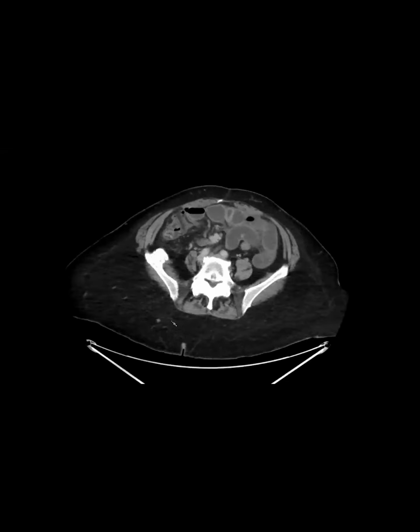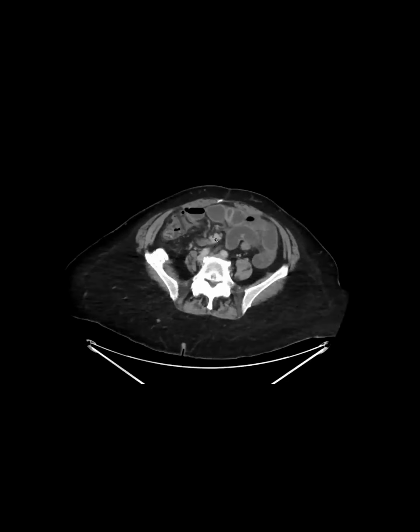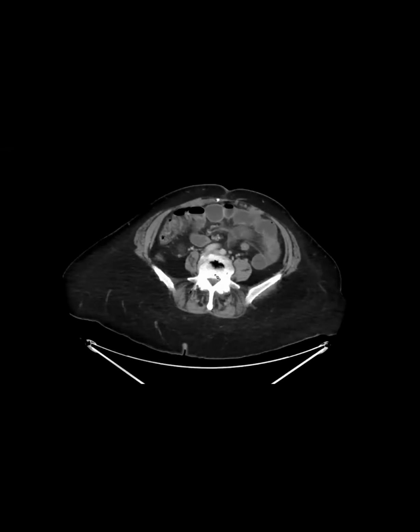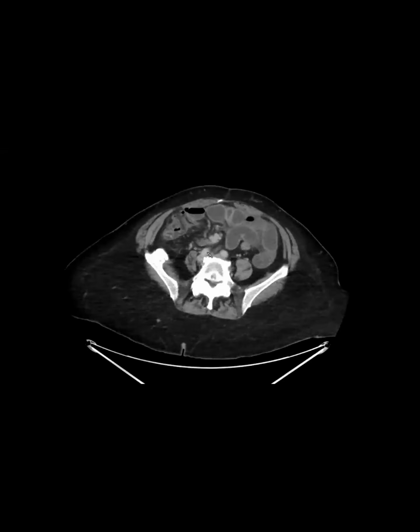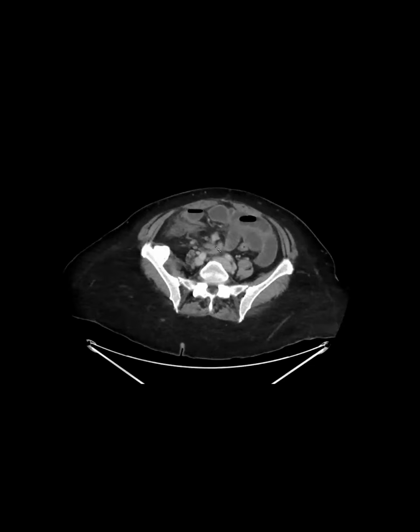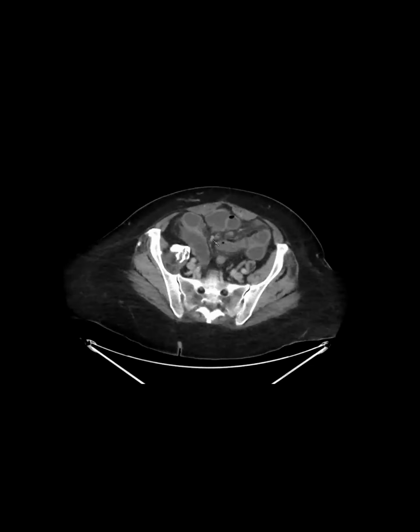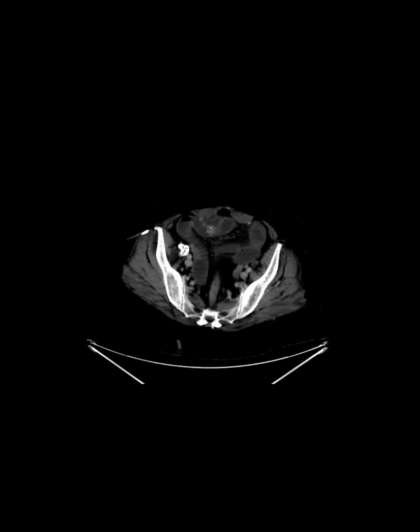Is that something in the mesentery, Aarti? Yes, exactly. Like a hyperenhancing lesion. So actually that was the point of transition of the bowel obstruction. You can see the bowel is dilated and then it goes by there. It gets kinked by this desmoplastic reaction from the serotonin that's being released, and then it's decompressed. And so if you're looking for a carcinoid, you go look at the bowel and there's probably a nodule there. Yeah, exactly.